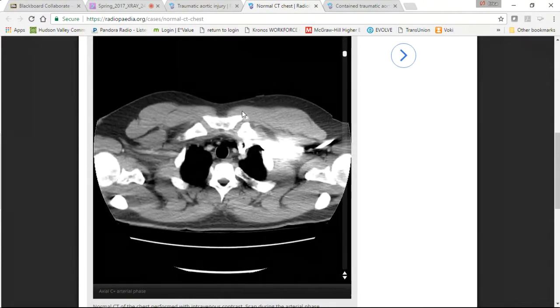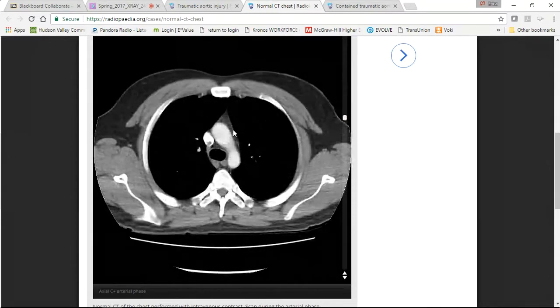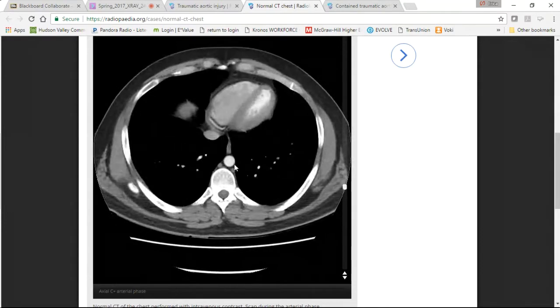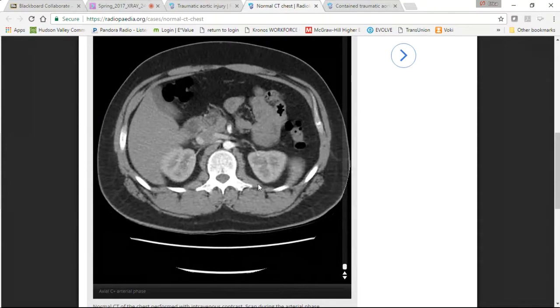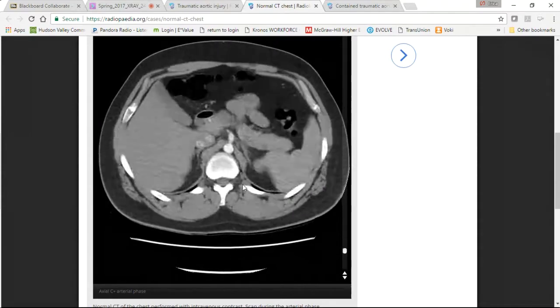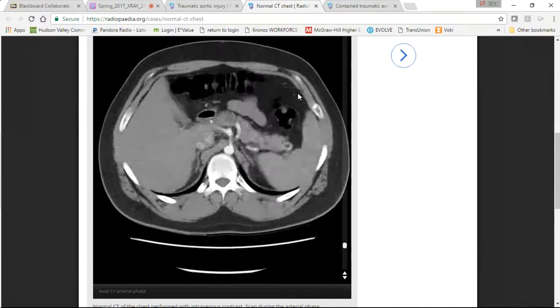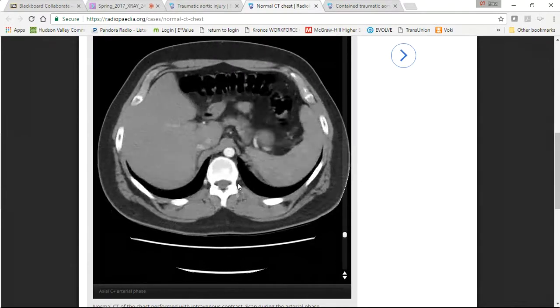Then we have to scroll down through the lungs, and our thoracic outlet is down here. The lower ribs, the 12th rib, come around, like an opposite circle tilted in the opposite direction.